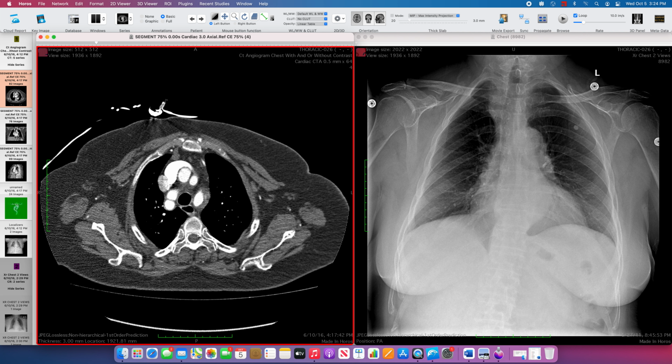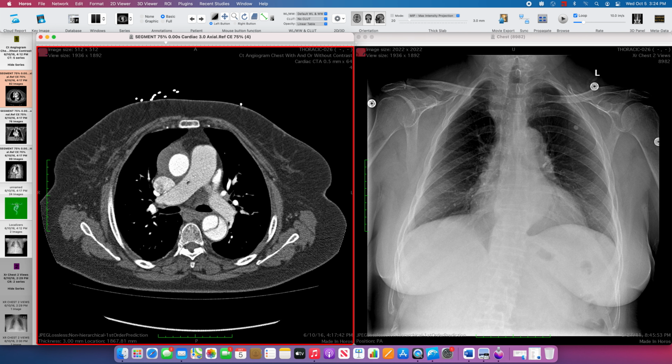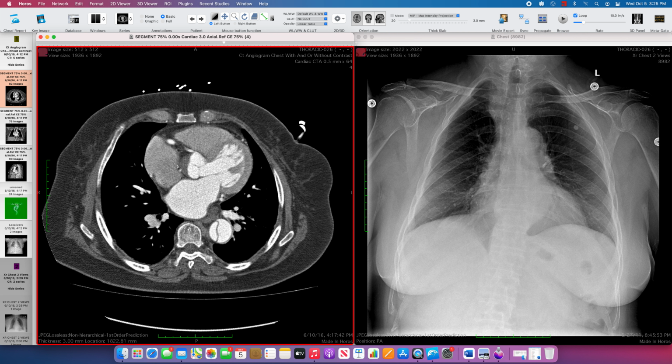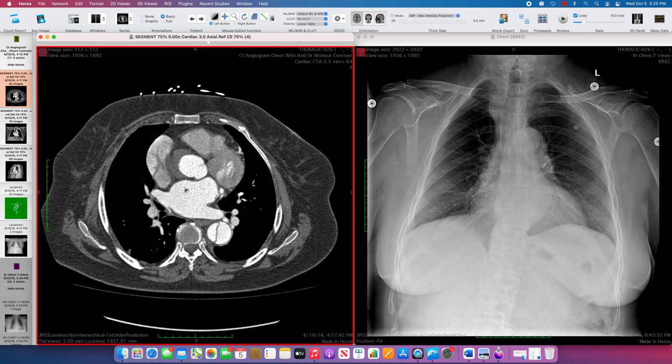So the bolus of contrast is in the aorta, and we get down to the aortic arch, and already we can tell that this does not look like the aortic arch that we've seen on other cases. We've got the central channel of contrast containing aorta. We've got this eccentric thickening of a portion of the ascending aorta, which extends all the way down to the level of the aortic root and the right and non-coronary cusps of the aortic root.